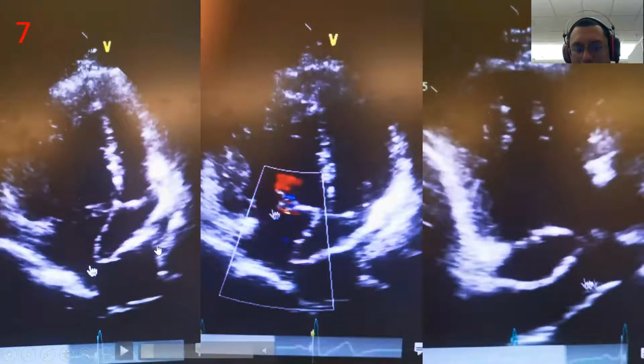Okay, so this is a pulmonary vein baffle going into the right ventricle. So you have a pulmonary vein, go to the left ventricle and go to the aorta. Go to the right ventricle and go to the pulmonary artery. Right ventricle, go to the aorta. Sorry, I'm also getting a headache.